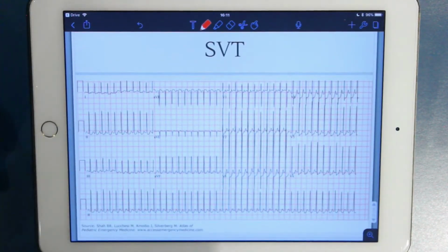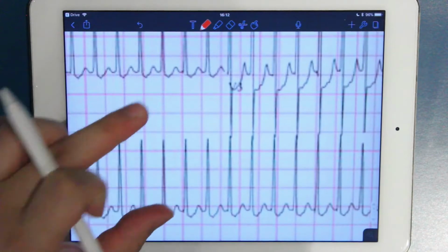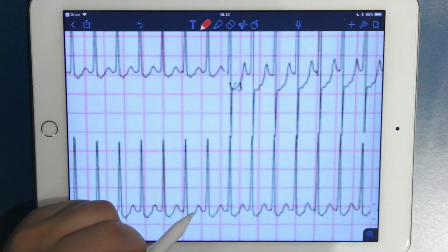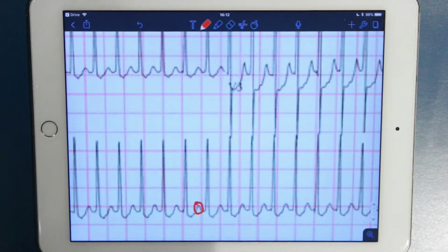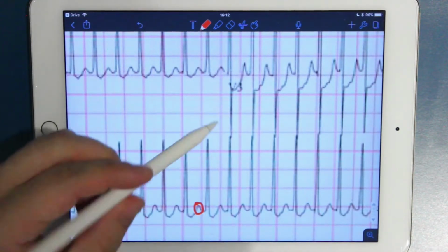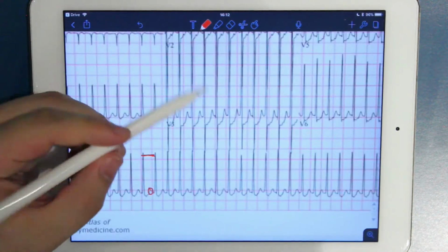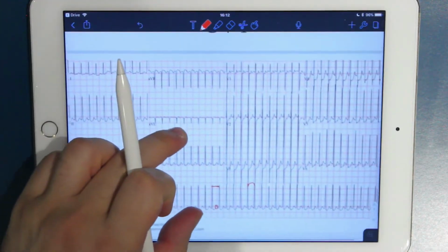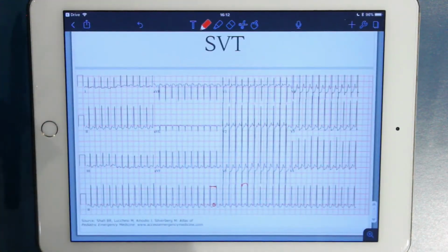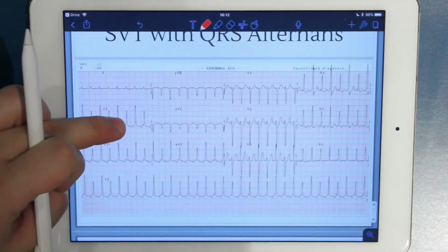Here's a supraventricular tachycardia with an extremely high rate of about 300. One notable feature of this wave is the fact that your T wave is completely taking up the space between each R wave. And that's simply because there's almost no distance here. If we were to use our rate and count from one big box to another, 300 divided by 1 gives this person a rate of 300. And so most features on an ECG will be obscured by the high heart rate.